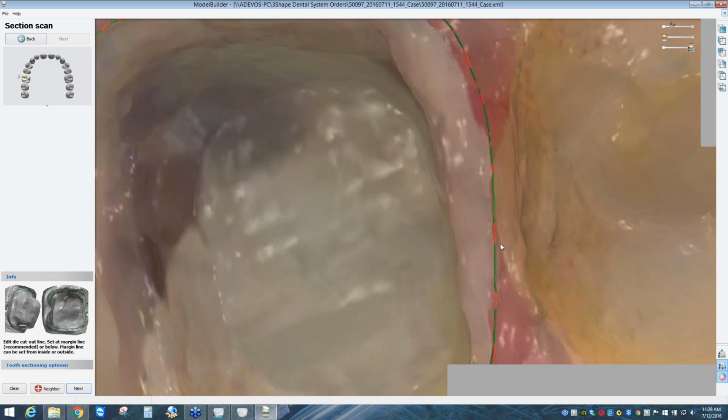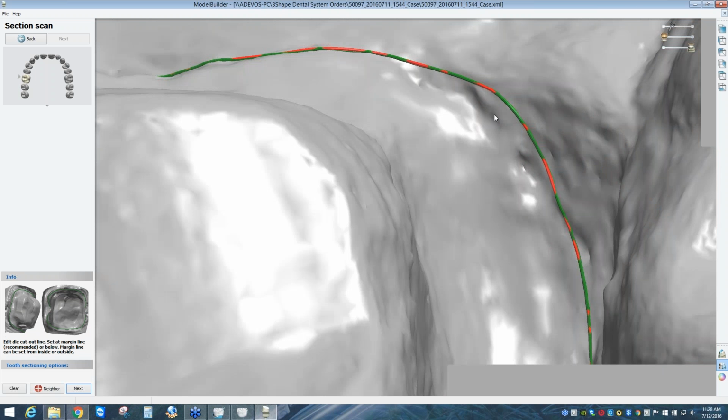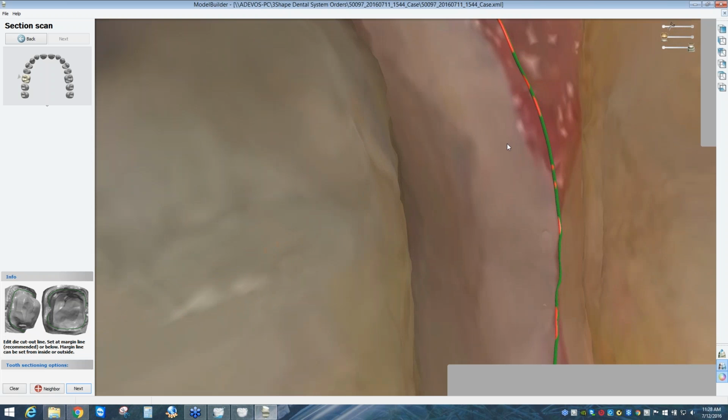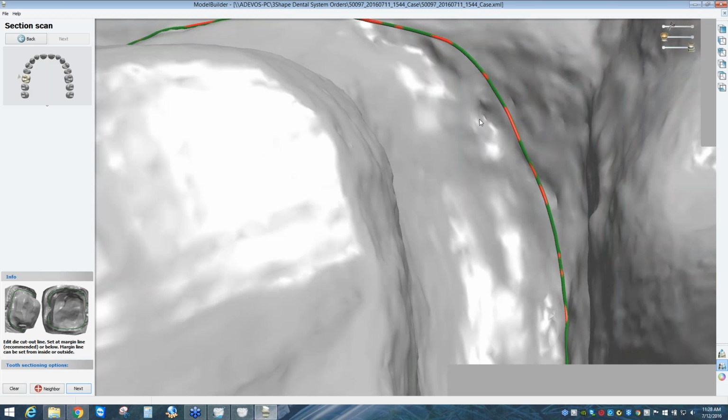So when you see things like this where you have, without color, a pretty smooth shape, but with color you still see a line of gingiva, that means that the original scan from the doctor might have to be retaken, otherwise the margin might be open. Typically what causes this or jagged sharp shapes near the margin is a lack of enough cord being packed in before scanning, or the saliva or blood from the patient pooling and causing some scanning inaccuracies.